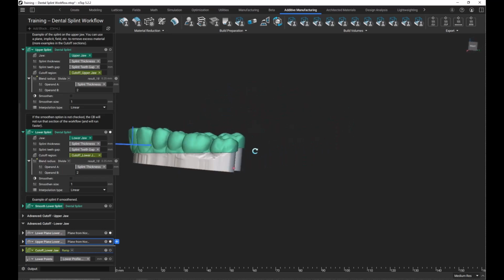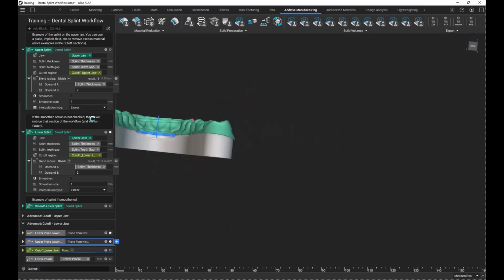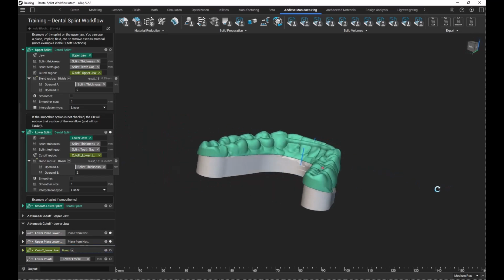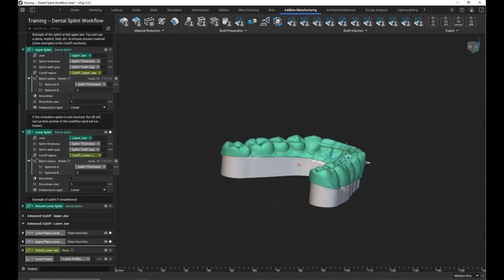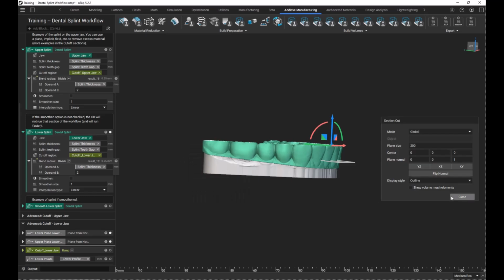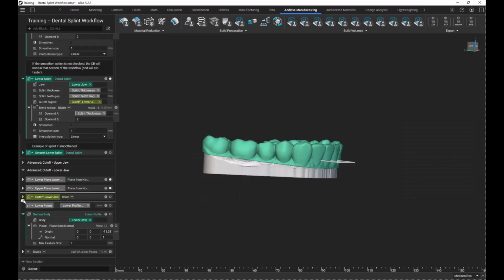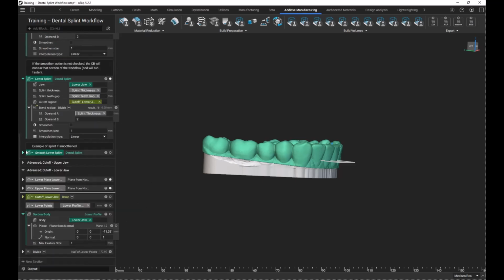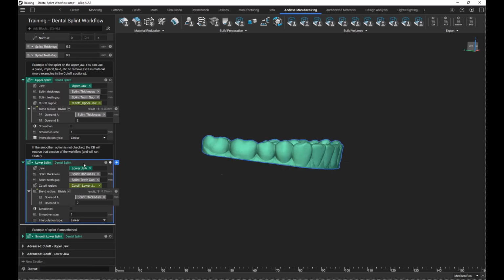So we can see it's a little bit different. For these, they're not as extreme as previous. But you can see that it is a little bit lower here at the top, higher at the other side. And then you can also see that this is also getting higher up, shorter distance for our geometry as we go farther back to the end of the teeth. So that's another thing that this is doing as well. A lot of steps are going on within this that I won't go into detail today, but again, another example of how we can have that.